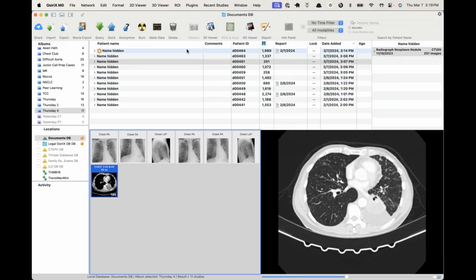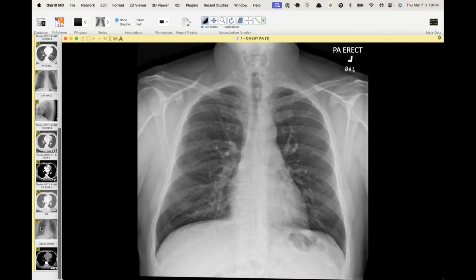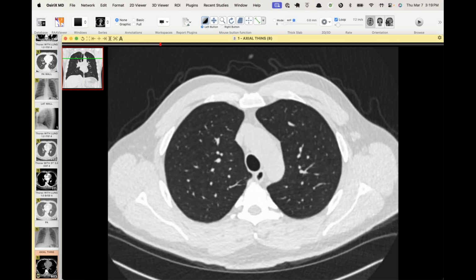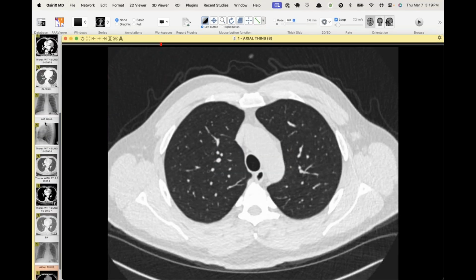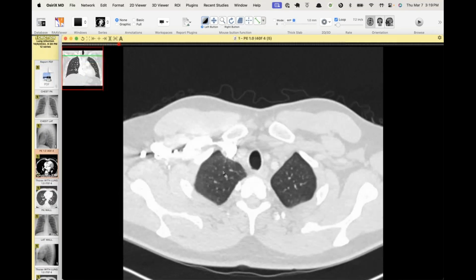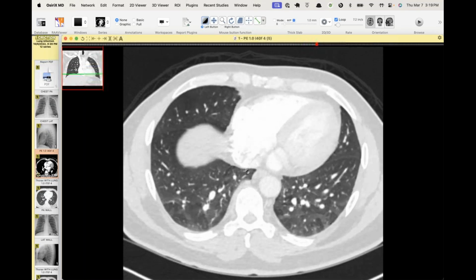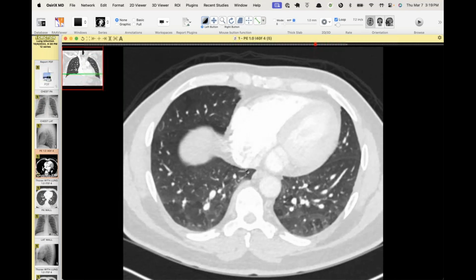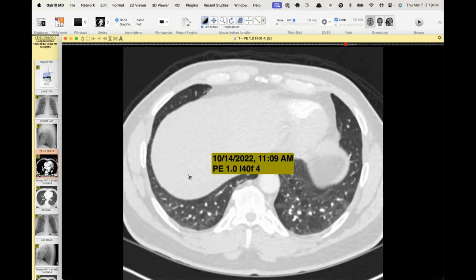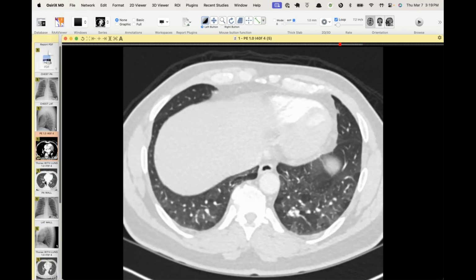Indeed. All right, David, you're ready for this one, hopefully. This one, I'm now 0 for 1 in prospectively diagnosing this in my career, and that's the ones I know of. So this guy is in his early 50s and had some generalized symptoms, including weight loss, some respiratory symptoms, some neurologic symptoms, and whatnot. And this is in 2022. He doesn't look that bad, October of 2022.